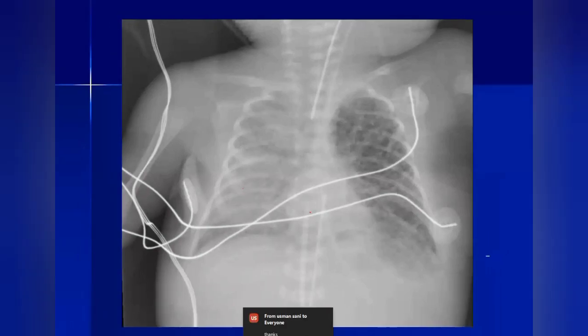Patient who is chronically ventilated because of RDS of a newborn, and it's almost 4 weeks after ETT intubation. And the patient starts to develop asymmetry in lucency of both lungs. So this is an X-ray chest frontal projection of a skeletally immature patient. The ETT is normally placed. I'm seeing multiple ECG leads, and also I'm able to appreciate that there appears to be an umbilical venous catheter and arterial catheter. They appear to be normally placed.